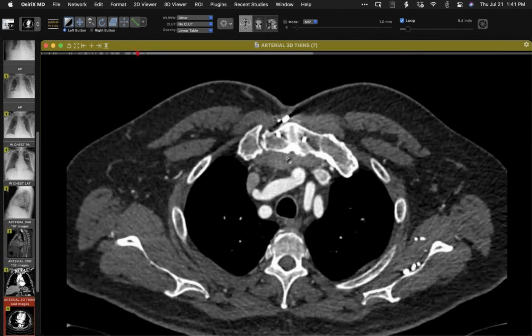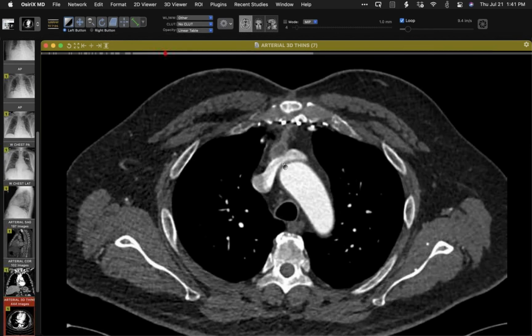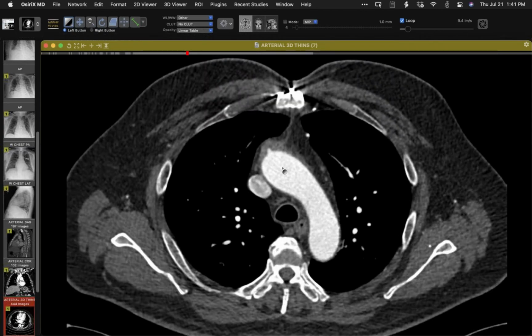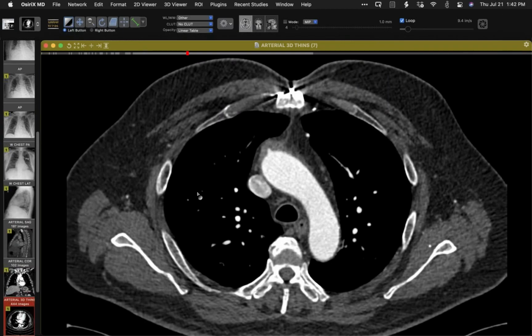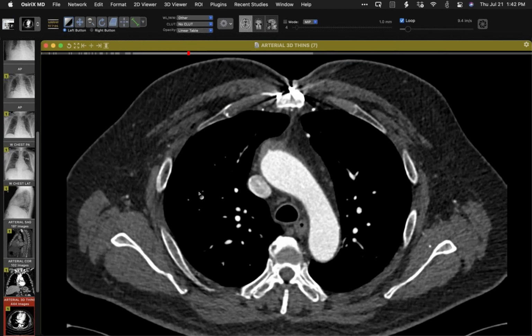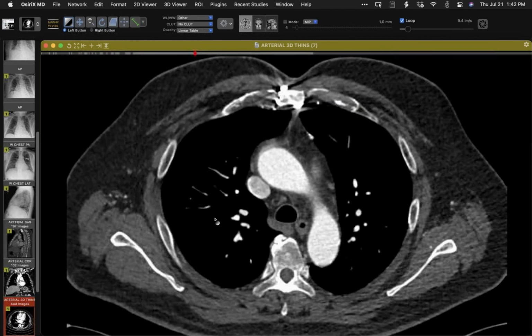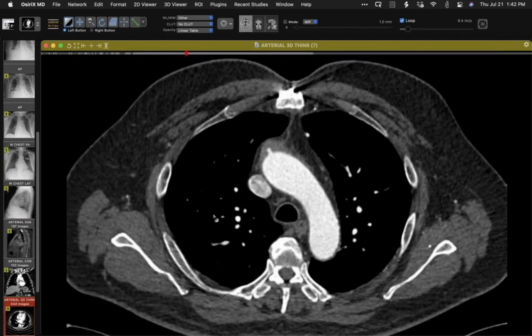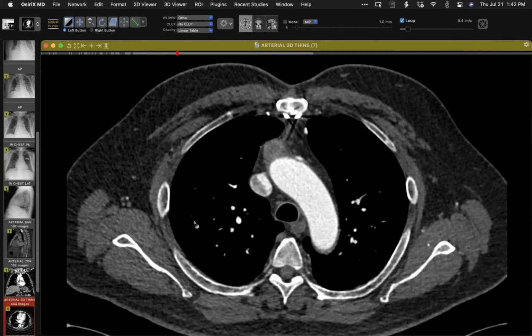And then it sort of disappears, blends in there. So you've got this to deal with, and you've got this to deal with. And it's really perplexing as to what one is looking at. Now, in the context of ordinary surgical management of aortic dissections and other things, we're used to thinking about things like cannulation sites, and oversewn graft stumps that can simulate a pseudoaneurysm when they're not a pseudoaneurysm. But in a case like this, it's really perplexing as to what this is all about.